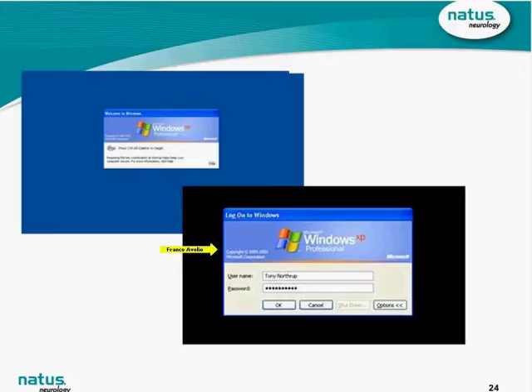You've logged under Windows, but it's kind of, I don't want to say the best of both worlds necessarily, but you get the option to utilize some of the services or some of the protection that is available in XLSecurity. Now, when you select logging under Windows, you do not get all of the features of XLSecurity.